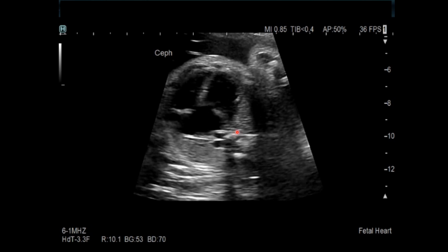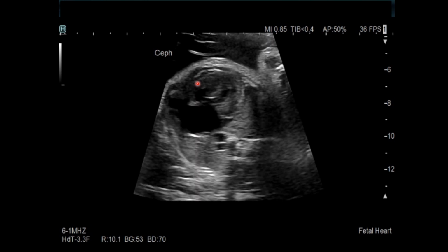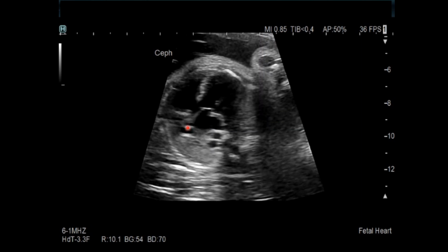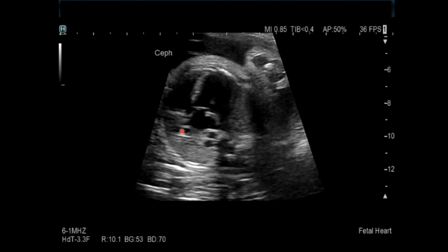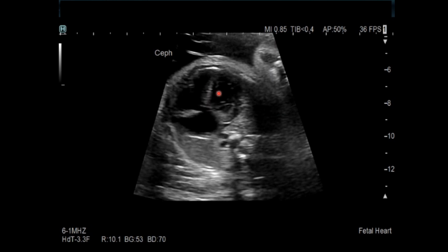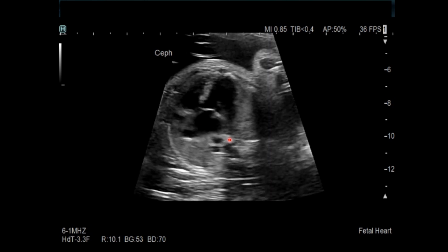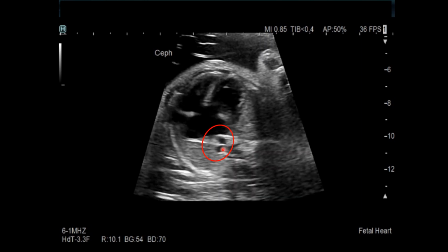The heart is large, but importantly you can see that the heart rhythm is not normal. This is complete atrioventricular heart block, where we can see that the atria are beating typically twice to 3 times the rate of the ventricular rate, and so this effective heart rate is going to be about 50. And you can see again the dilated hemiazygous vein in this case.